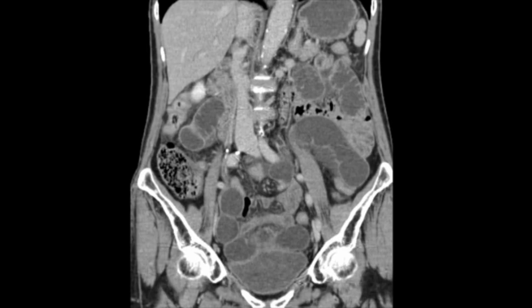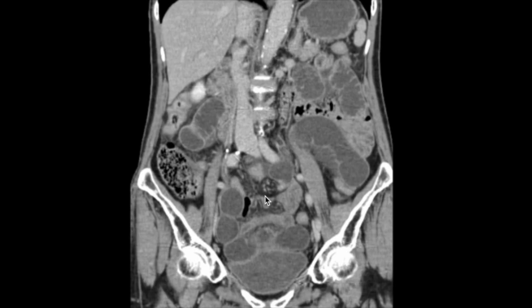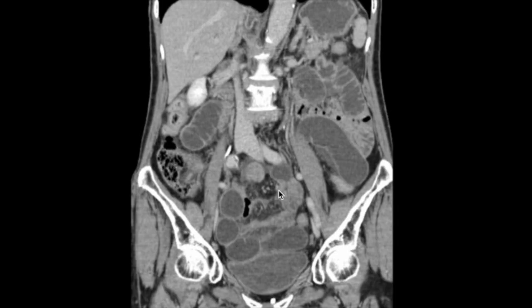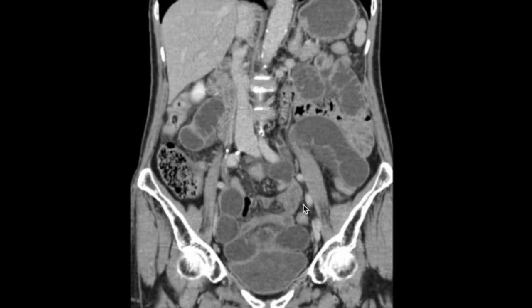But in this case, it doesn't appear that something is lodged inside, nor did cancer cause the wall to bulge and occlude the lumen. Instead, because the small intestine suddenly narrows and displays a beak sign, we can infer that it's likely adhesive obstruction, where the bowel has adhered to some other area and become tight there.